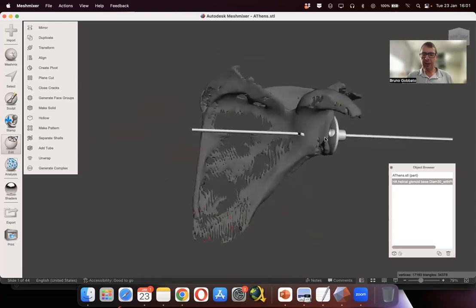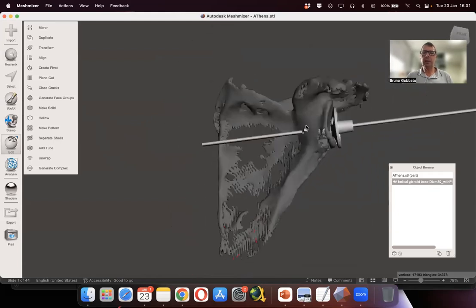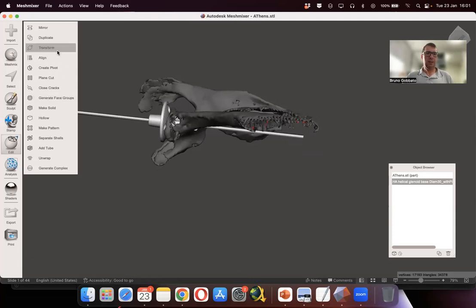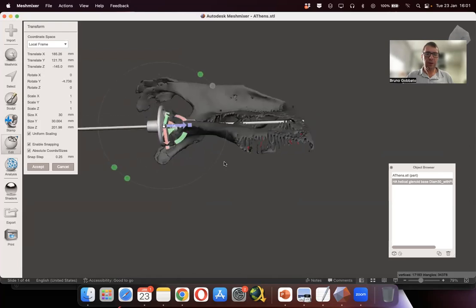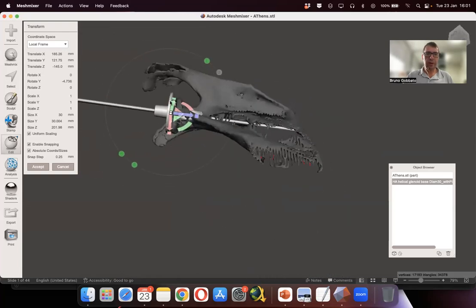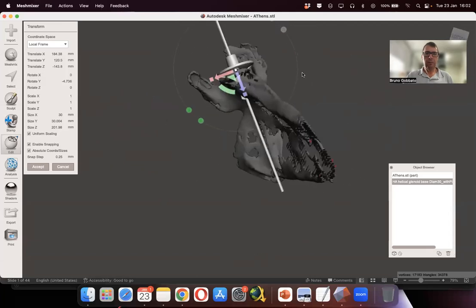As we can see here, the implant is going a little bit in the anterior part. It's exiting a little bit in the anterior part. It's not correct in the axis. Let's correct it. Let's change a little bit the retroversion of the implant to make sure everything's correct. It's not correct on the posterior part. Let's move a little bit to anterior. Okay, not good enough. Let's change.